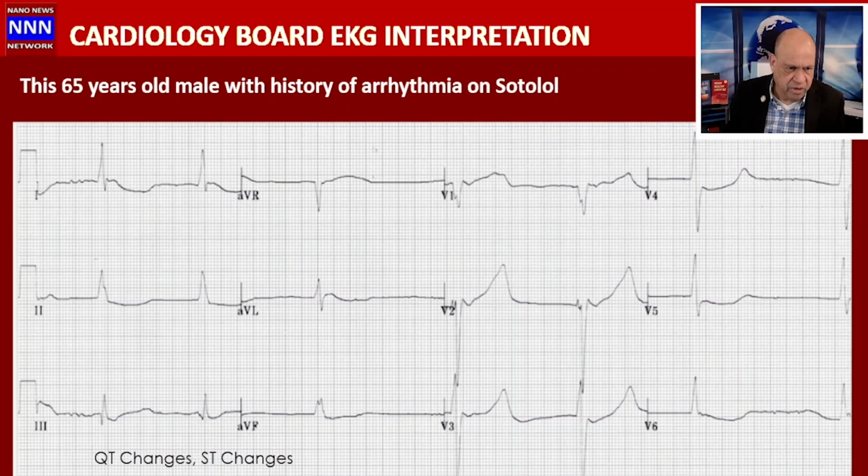And here's an example of a 65-year-old male with a history of arrhythmia on sotalol. We can't get any better tip-off than this. Whenever patients are on antiarrhythmics, you should know the mechanism of action of these antiarrhythmics as a cardiology fellow or as a cardiologist. And antiarrhythmics, especially sotalol and other drugs, prolong the QT interval.